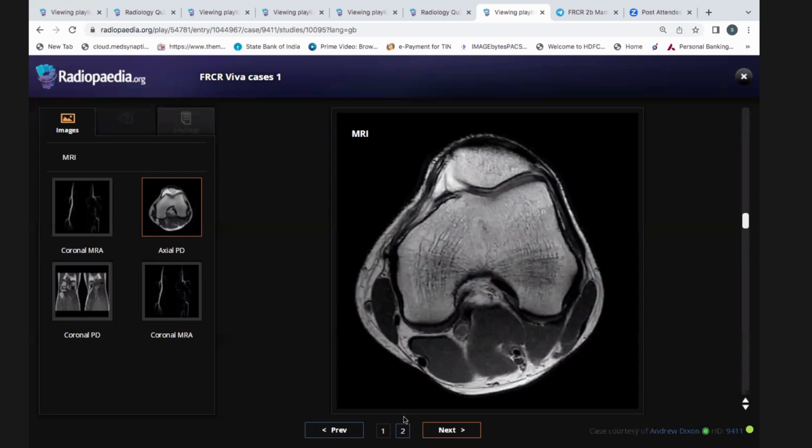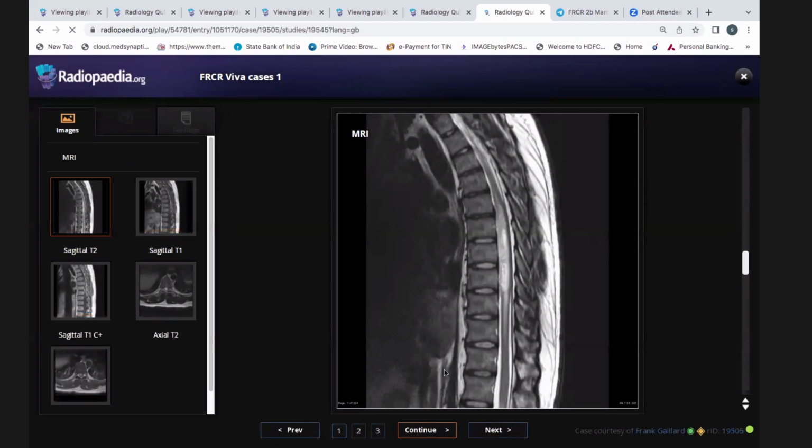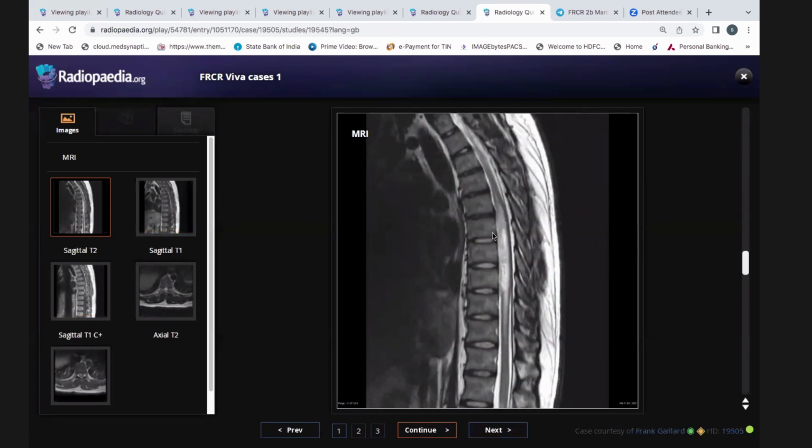The slip would be something different. And as you would always note the history, I had told that the patient has presented with acute symptoms. So that urgent word should come down in your notes, because it's a critical ischemia kind of thing. So it needs an urgent attention. Yes. Then this case, yes, you are right, bang on, eccentric, you can see some exophytic component, and all the differential diagnosis and the findings were right.